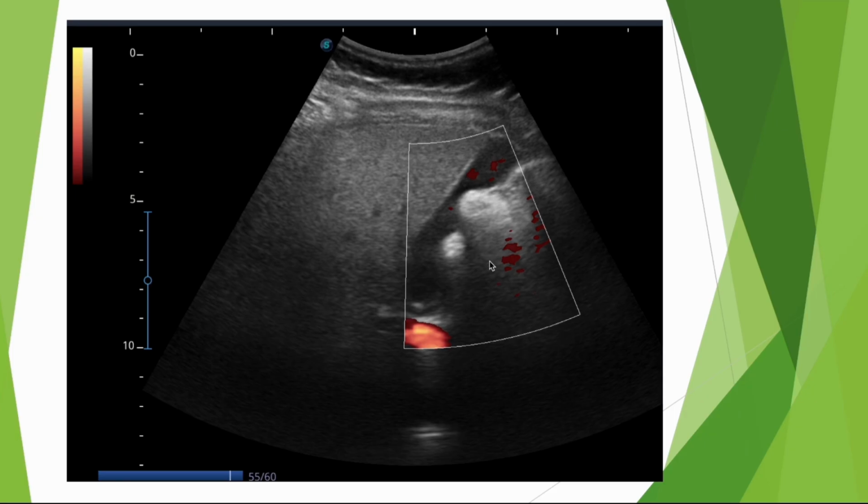Actually, in reality, they do show a shadow cone, but it's what we would call an impure shadow cone, unlike the shadow cones of calcified images, which would be a pure shadow cone. Normally, it would be a black shadow cone, an anechoic shadow cone, but here, not at all. We have an impure shadow cone. We have a gray shadow cone. You can see that behind this image there is a gray shadow cone, and here as well, what we call an impure shadow cone.